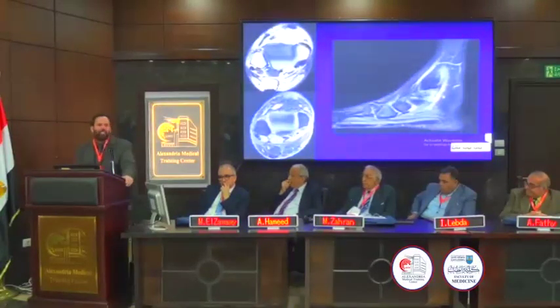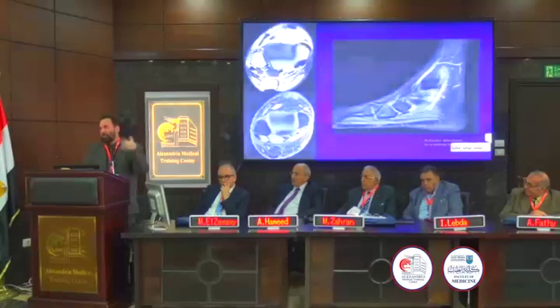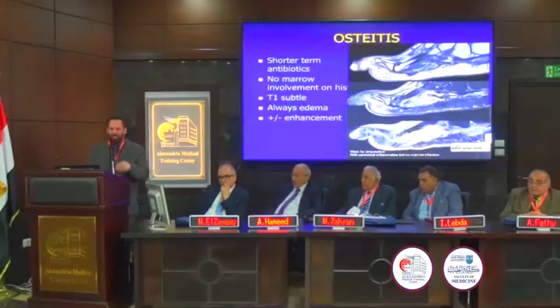And septic tenosynovitis, only can diagnose, in my opinion, with contrast, and only when you have more than one tendon visible. So here is enhancement of the posterior tibial tendon, see it here. But this could be rheumatoid, this could be reactive arthritis or Reiter syndrome. You don't know, it's just inflammatory tenosynovitis.